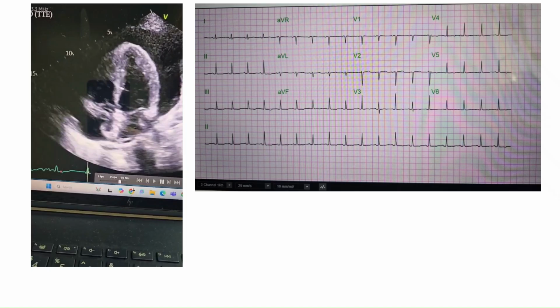And here on the EKG, this is a real patient I had during residency, and we identified it at the bedside, and he also had this electrical alternans. You can see different QRS complexes in terms of the amplitude, okay? So I think it's very obvious what we are talking about.